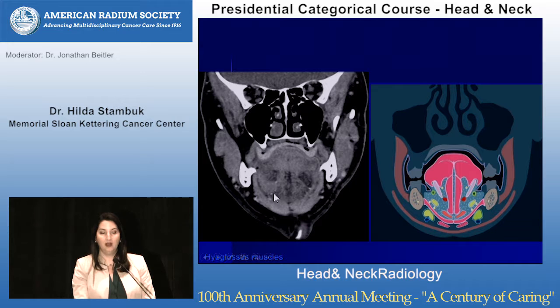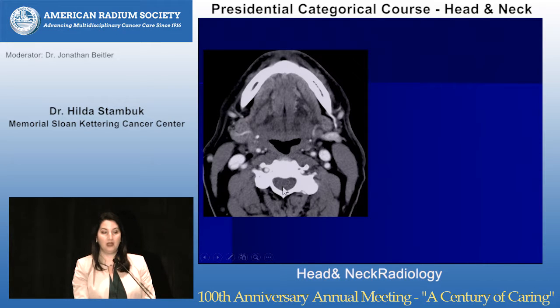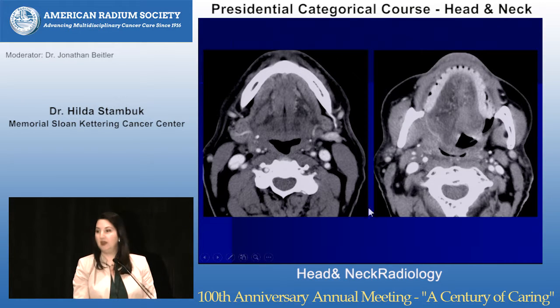Okay, let's look at this poor patient who has a normal mylohyoid, hyoglossus muscle, normal mylohyoid. This is tumor. This is a T4 tumor from the right tonsil tumor. And after treatment, their tonsil tumor got much better. They just got a little bit, I guess, lucky. Some of the tumor went down, but not much. And over time, they failed miserably.